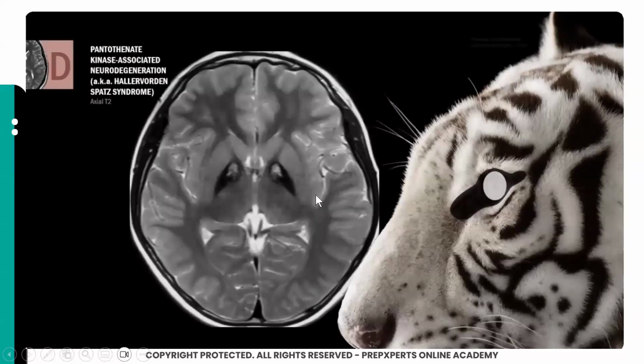This is our case that is also in our neurodegenerative diseases. This is actually due to accumulation of iron. So iron is sitting up in the basal ganglia, and this is the famous eye of tiger sign. So we know that this is T2 hypo. This T2 hyper area is due to gliosis. The cell death is called gliosis. This is gliosis, but this whole basal ganglia is black. This is black due to iron accumulation. So the ferromagnetic substances are black on T2.